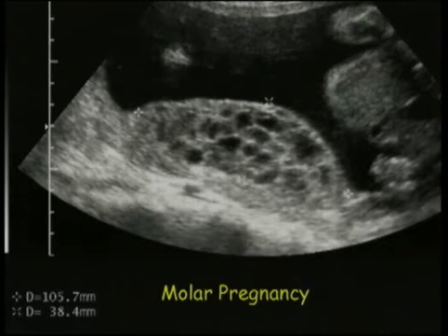And here we can see a molar pregnancy that is seen in this case with a viable fetus along with it, but often our molar pregnancies will be seen in isolation as these multiple large irregular cystic spaces within the uterus.